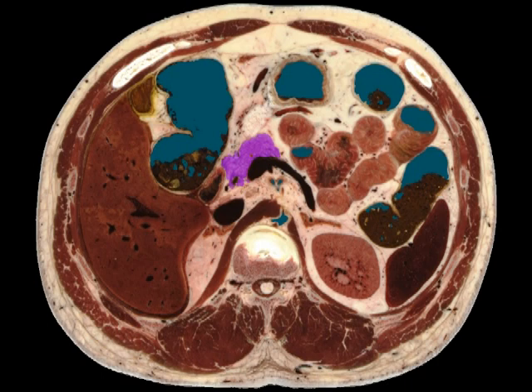Please understand that when making this video, the intent is very simple. We want you to recognize normal anatomy using cross-sectional radiographs or transverse images from VH Dissector to correlate with the ultrasound images. This takes years to develop this skill, so don't feel bad if you can't look at the image right away and see anything more than what looks like a bunch of clouds in the sky.